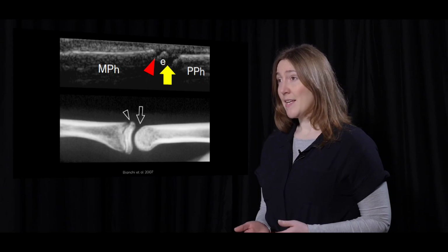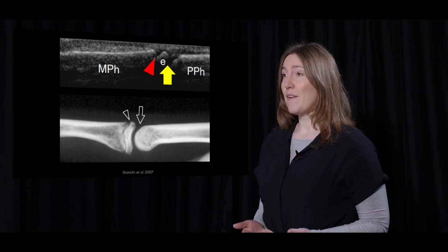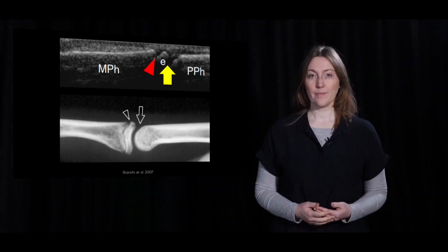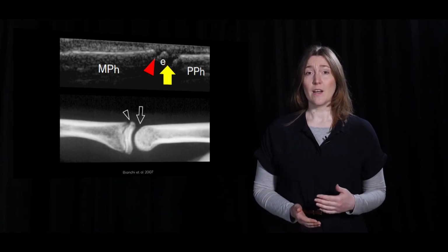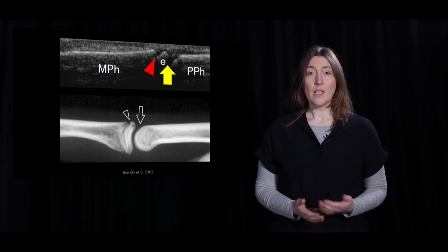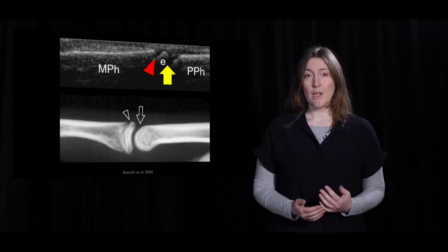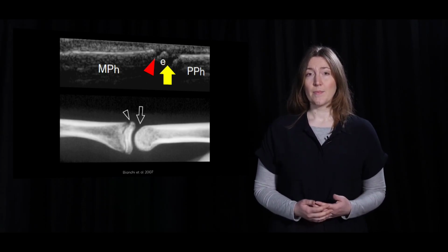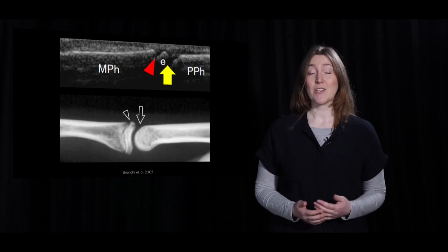The red arrowhead is pointing to the growing plate, which is responsible for allowing the shaft of the bone to lengthen until full growth is obtained. The epiphysis fuses to the diaphysis by bone when the cartilaginous growing plate becomes ossified. In the lower X-ray image, you'll see a radiographic correlation. So be aware of growing plates if scanning children. You wouldn't be the first one to mistakenly diagnose the growing plate as a fracture of the bone.